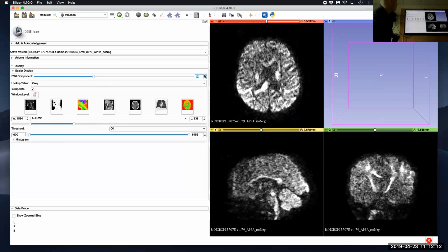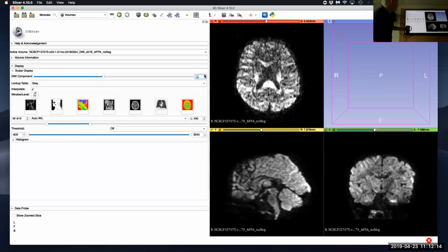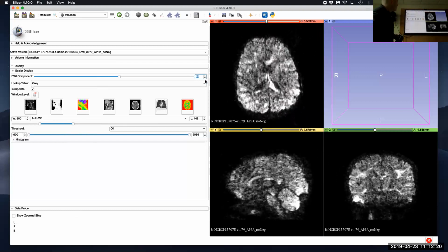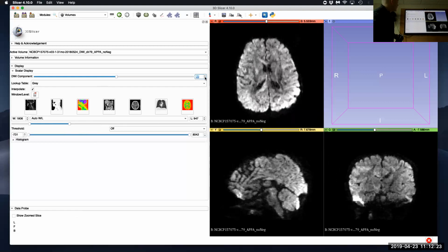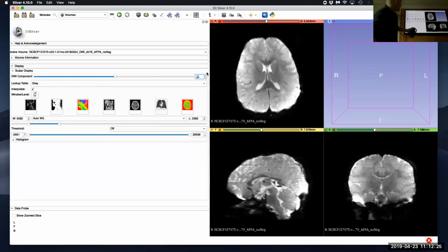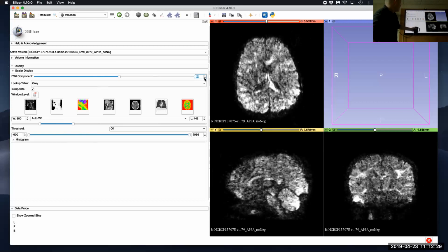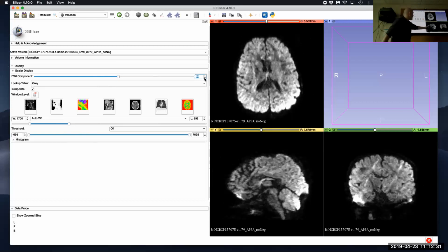You can also sometimes see there's motion from one slice to the next. If you look here, you can see the brain going back and forth in part, and also you can see bad data. For example, this one here is not a good baseline. This one data set is probably not good either. That is motion. You see here the jaggedness in the image.